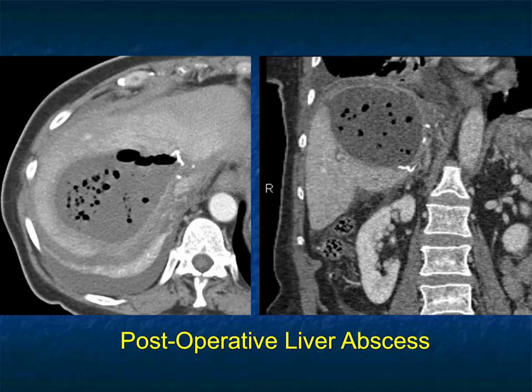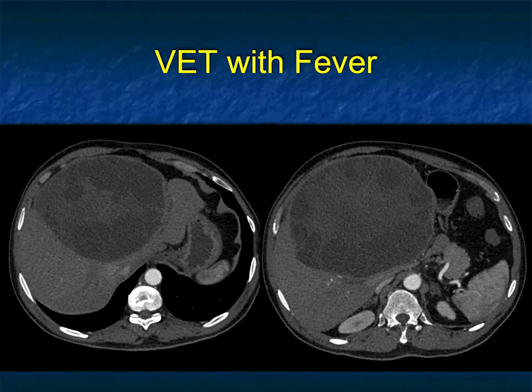And of course, when you have air bubbles, it makes it very simple. When you look for air bubbles in an abscess, it's probably about 10% of abscesses. So if you need to see air bubbles in an abscess, that was something that was spoken about 40 years ago, you're going to miss 90% of abscesses. So you better start calling them without the presence of air. Now, there are unusual infections.